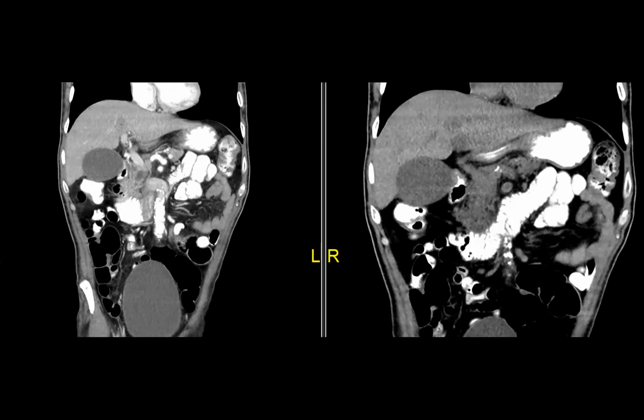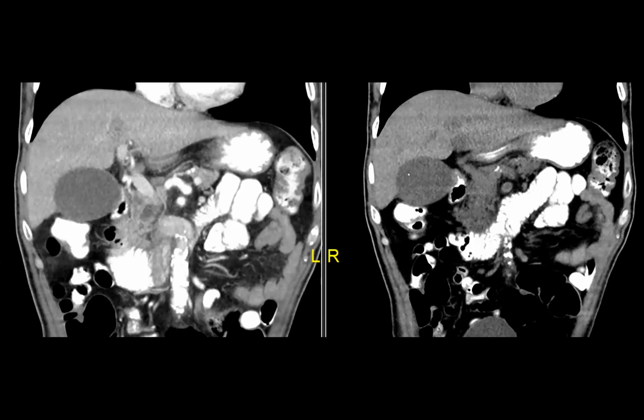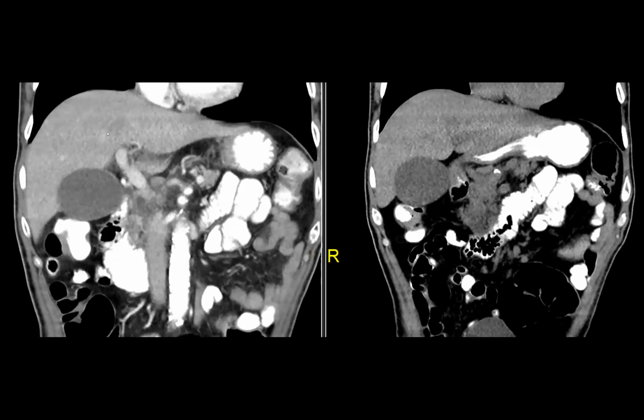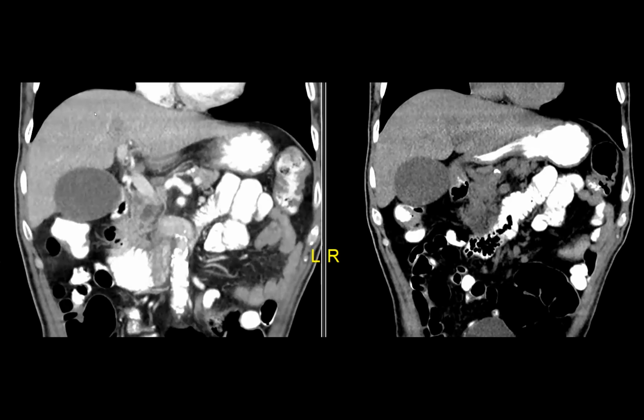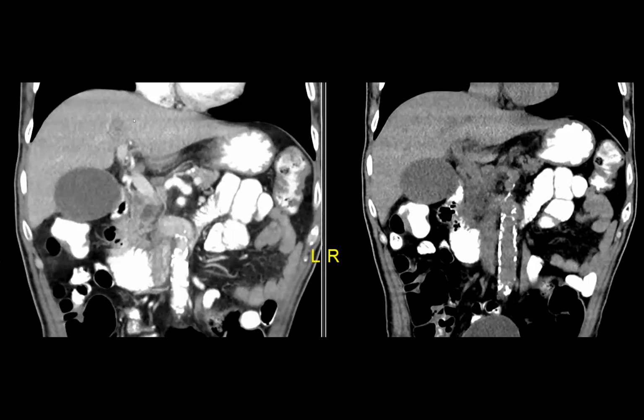I really like that paper. I think they published it, right? Yes, it was published in Radiology. I mean, I can see how this is easily dismissed. Without pre-contrast, I think this would be a very tough call. Although I agree, the coronals here are much more convincing.